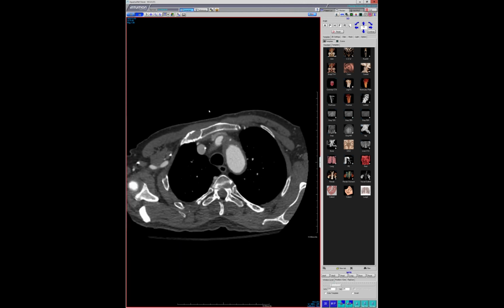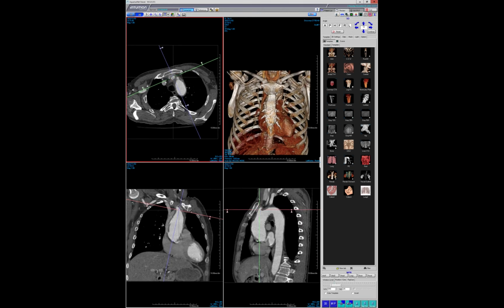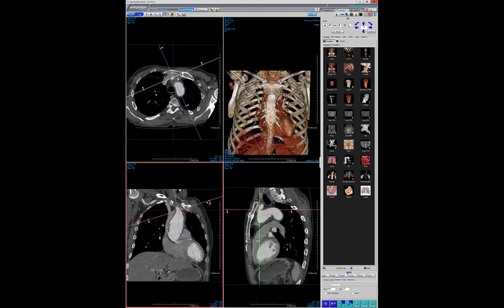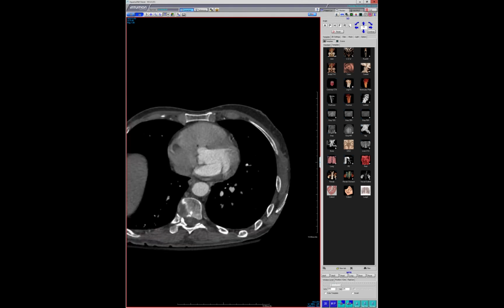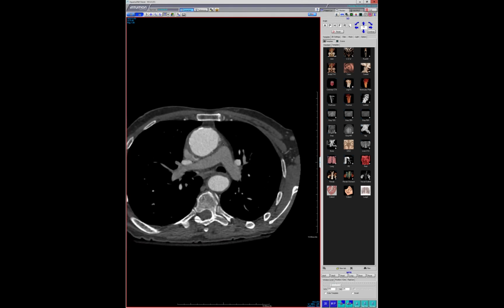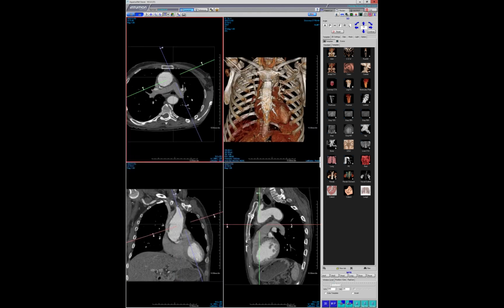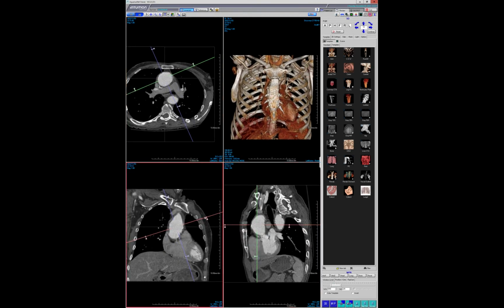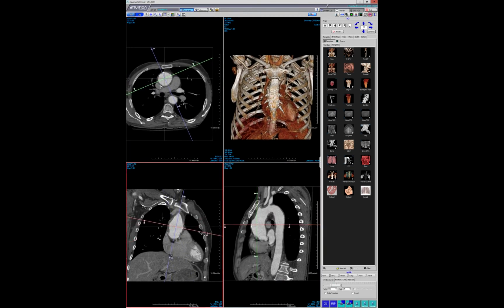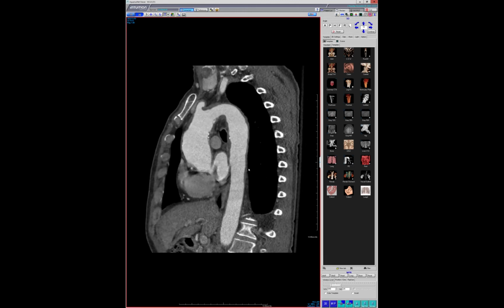Well, the right brachiocephalic is a little, yeah, it's not that meaty. I mean, the other findings you discussed, the descending thoracic aorta has little flecks, but nothing like the ascending, which isn't that bad, but more circumferential. Yeah. And when I just Googled syphilitic aortitis CT, I have to say this case would have fit right in with every other case that's available online.